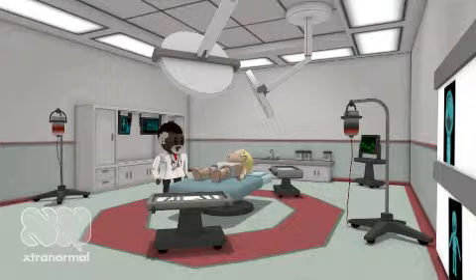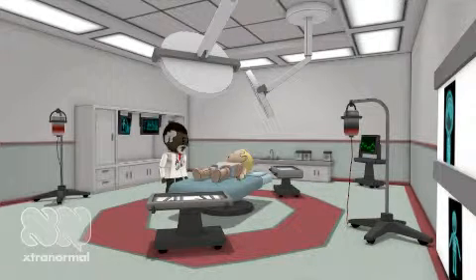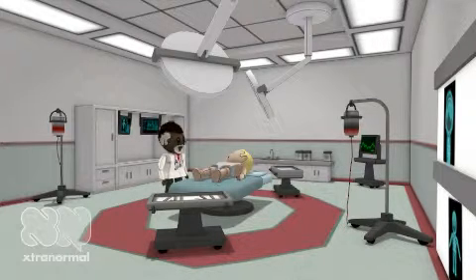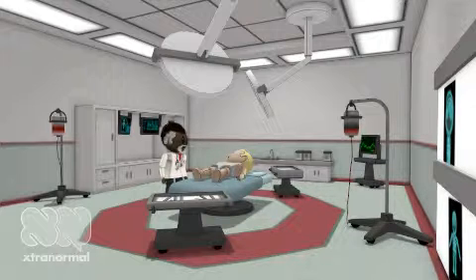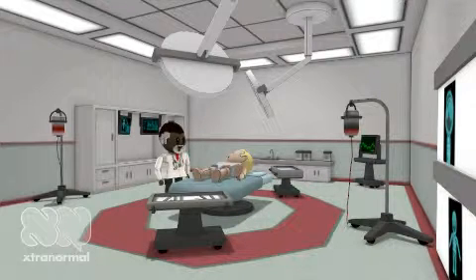Pressure targeted assist control ventilation. Each breath is a ventilator breath triggered by the patient. Flow time tracing is consistent with that during control pressure ventilation. Pressure time scalar shows a small negative deflection prior to delivery of a mechanical breath. Volume time tracing is similar to a control breath.